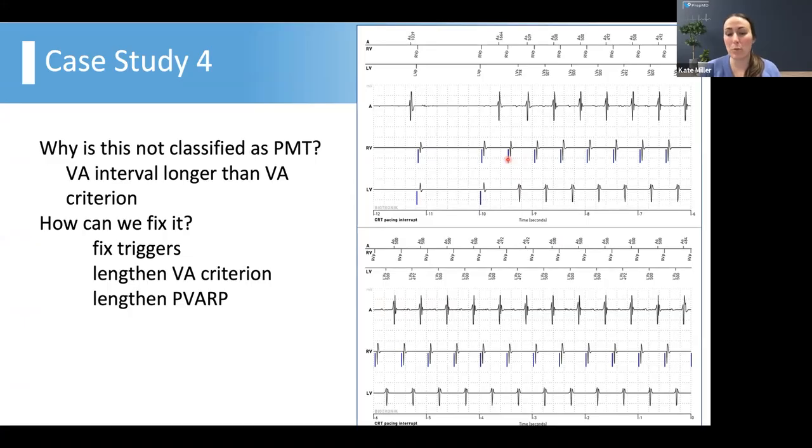So, what do we do when we identify this? We fix the trigger. In this case, the trigger is the VDD pacing. So we can't really fix that problem unless we add an atrial lead that allows for atrial pacing, which is obviously very invasive. But we're trying to increase the BiV pacing percentage, so it's probably a consideration. Increasing the base rate may or may not help, probably not, because again, what we're losing here is the AV synchrony.